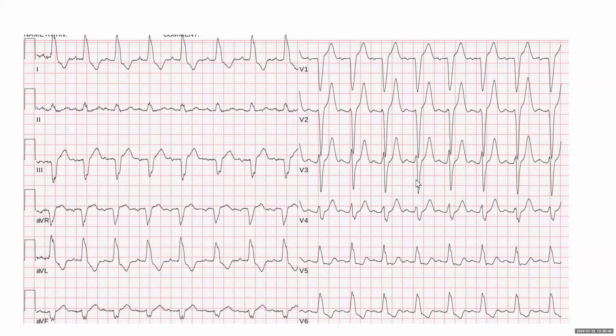Abdulaziz, I missed it. Sinus tachy 1, complete 2, STT. You're right. Sorry, I missed it.